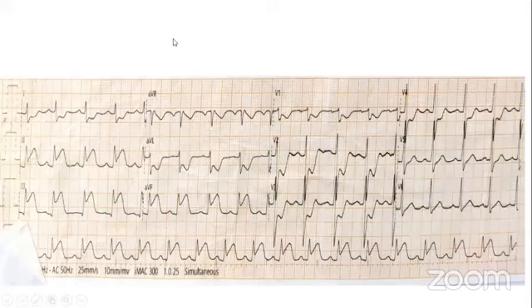Naim Hassan: Yes, sir. So this is the 12-lead surface ECG showing normal sinus rhythm. Heart rate is around 100 beats per minute, and there is ST elevation in 2, 3, and AVF with ST depression in 1 and AVL, and also ST depression from V1 to V4 with upright T wave, and also tall R wave in V2, V3.